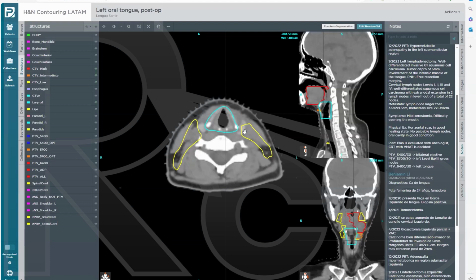But I just wanted to illustrate that we want to be mindful of the thyroid gland here and also be consistent. You see how here someone is coming up more appropriately anteriorly, but then one slice up is like this. That's the difference when you're drawing, from a 2D and 3D era to IMRT, it does take some time to draw these. Sometimes planning software will have an interpolation option. So you can draw once every 2 slices or once every 3 slices and interpolate and review and make edits to save a little bit of time. But you have to be mindful of being consistent here.